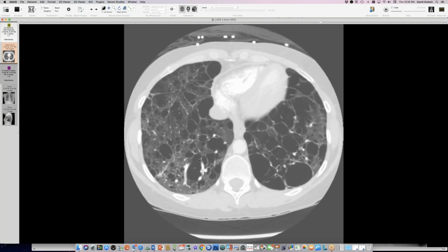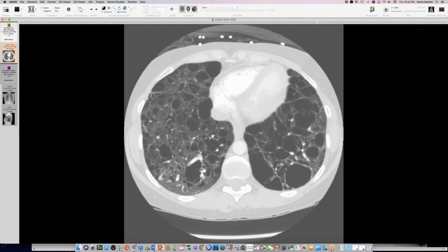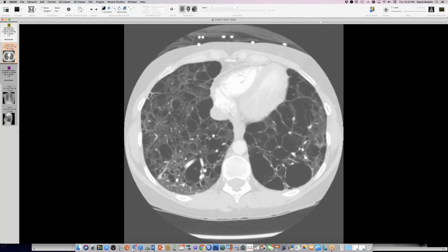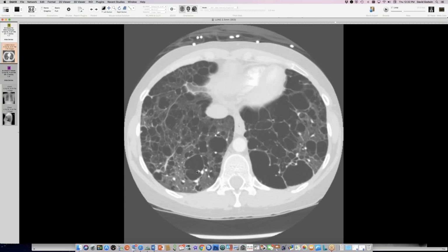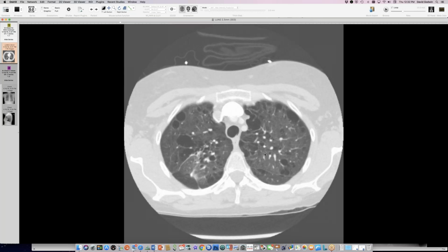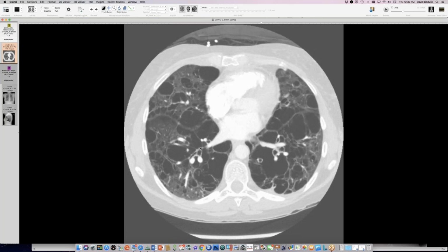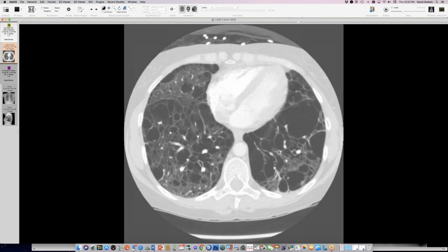I mean, you can see that cyst right there with the big vessel going around it. But with emphysema, to me, the vessels sort of go away or get small. And in this case, the intervening lung is normalish. Yeah, but these cysts are not empty. Maybe we're just seeing cyst walls, but maybe we're seeing some residual arteries and tissue strands, things that would make me think this could be emphysema. I thought of Langerhans cell histiocytosis as a cause of cysts that get to be quite large and irregular and look really messy.